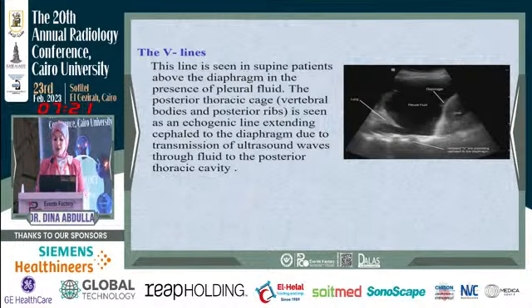Here is a suggested classification of the thoracic artifacts. They help us in differential diagnosis of different pathologies. At first, when we see an artifact, we should decide, is it at the pleural line or superficial to the pleural line? If it's at the pleural line, horizontal A-line artifacts are present in normal lung, while the other vertical artifacts are comet tail or B-line artifacts. If they are short and ill-defined, they are Z-lines. If they are long and reach the bottom of the screen, they are called B-lines.